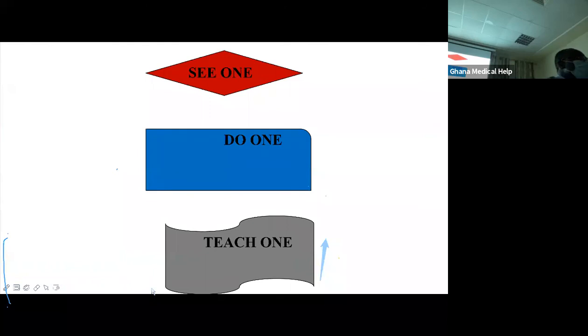And AVR or AVL. Yeah, so AVR is the true right-sided lead. It's always negative. If you find a positive, you have to run for your life. Is that the only lead supposed to be negative? Yes. So the only right-sided lead is AVR, typically, though sometimes it depends on the way the leads are placed.